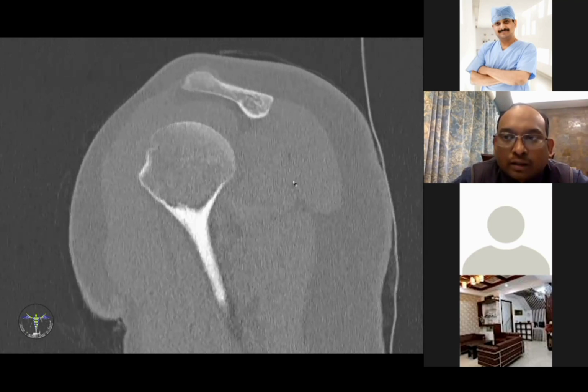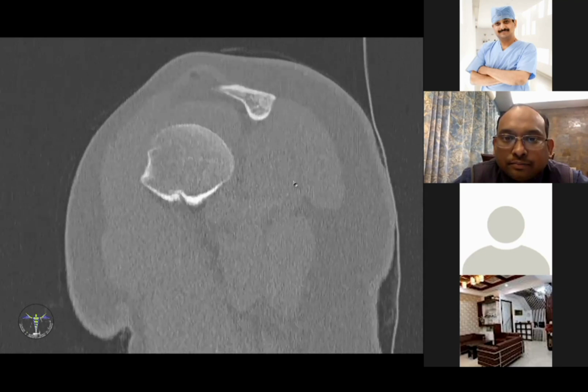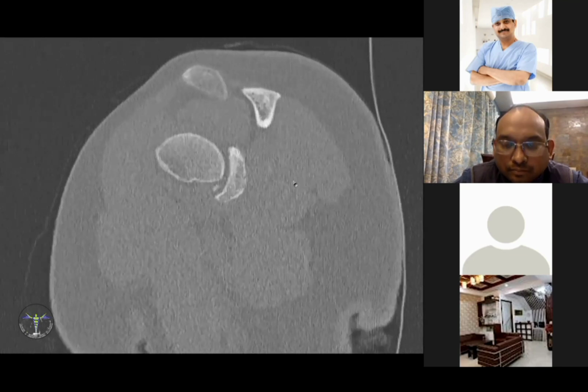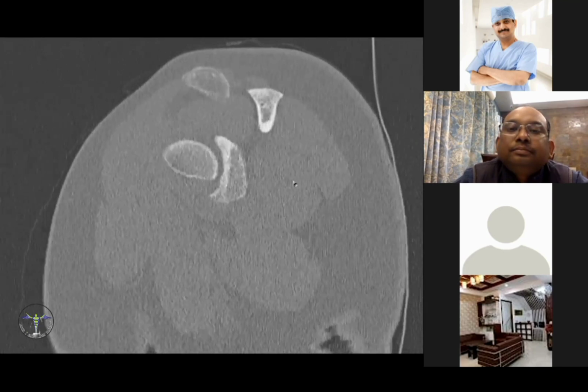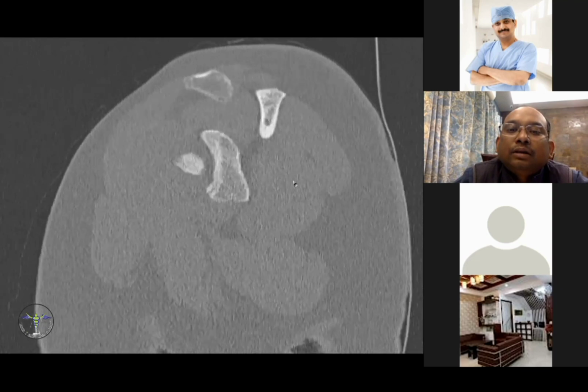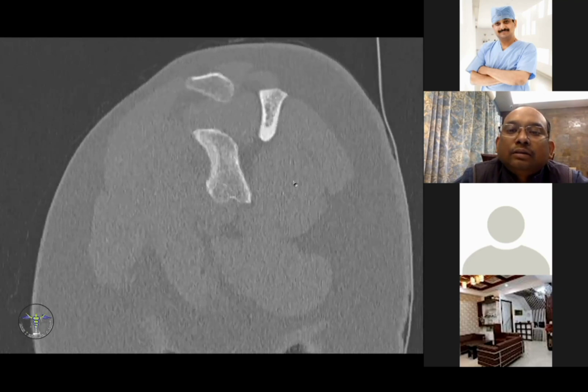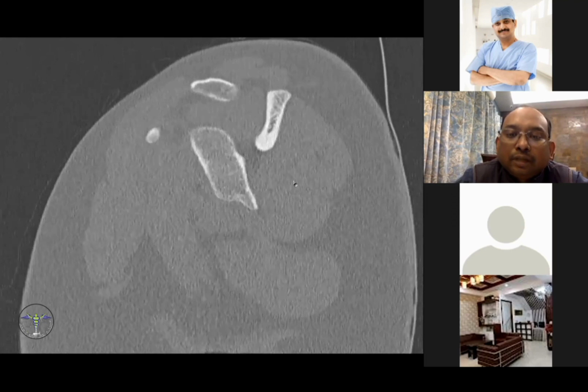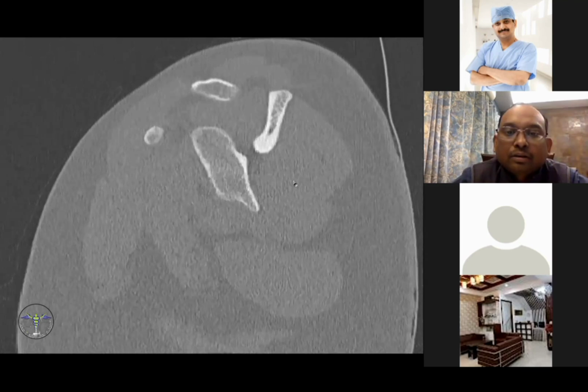Capital D is the normal glenoid without a bone loss. But engaging or non-engaging will depend on bone loss. With the same amount of Hill-Sachs, the bone loss will make it engaging or non-engaging. So we have to measure it from the small d, minus the remaining bone.